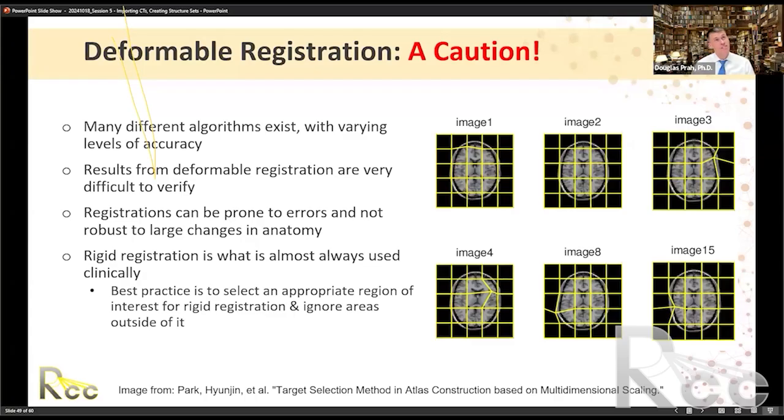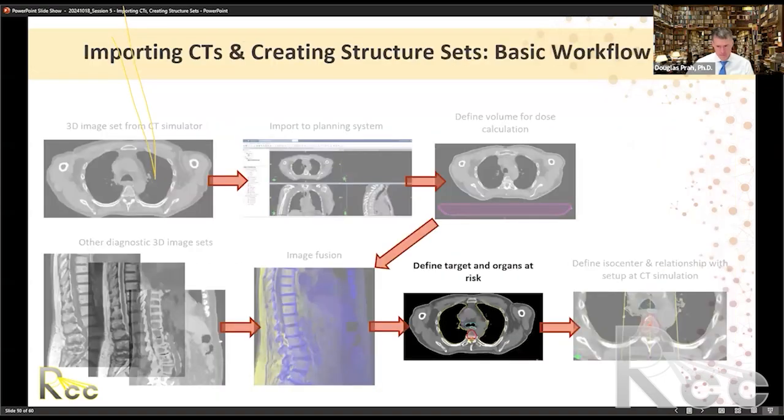So you could envision the case of an abdomen, where you had the liver moving up and down or in a different position, or the stomach was filled with different food on one day compared to the other. A deformable registration will try to match the external surface of the stomach up from day to day, and so you'll see some stretching and moving inside of the patient. And there's definitely different parts of this that are going to be more difficult to handle. Small bowel, large bowel, things like this, usually these algorithms really struggle with, so I wouldn't even bother in these sort of areas using those algorithms until better tools come out for that.